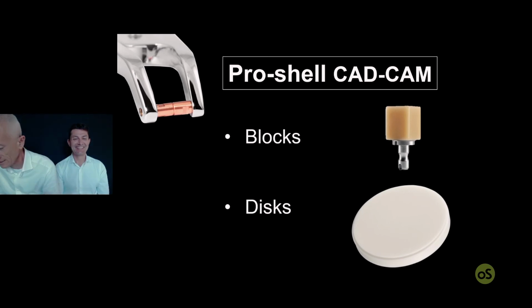Okay, so maybe your patient wants a collection of bridges, and you can print 20 bridges with 20 different colors, and then you can change the bridge whenever his mood is changing. Okay, jokes aside, let's move to the next step, that is disc.